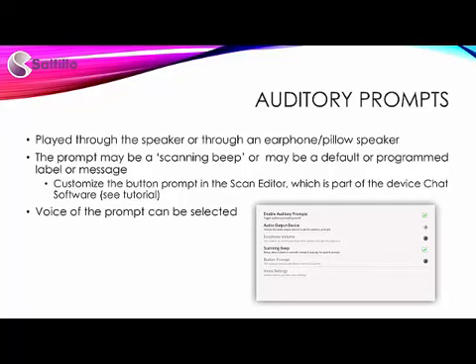The auditory prompts may be played through a speaker, earphone, or pillow speaker. The prompt may be heard as a scanning beep or may be a label or message. The label or message can be customized through the Scan Editor, which is part of the device chat software. Please see the Scan Editor tutorial.